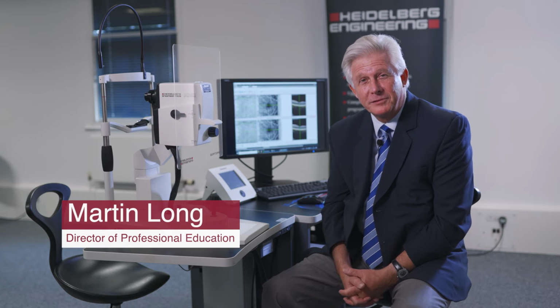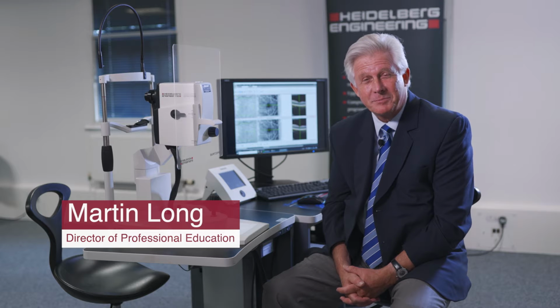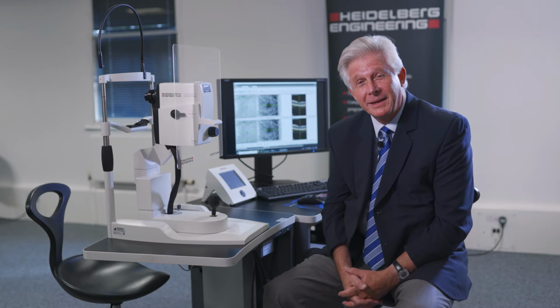So let's talk about OCT angiography on the Spectralis. The OCTA module is part of the multimodal platform, and of course you can correlate that with the other imaging modes that are available within the platform, and hopefully taking a holistic approach will give you much more confidence in your assessment of each eye.